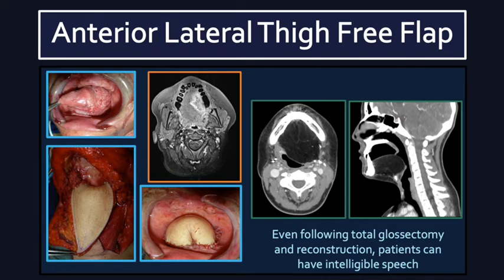Notice the mounding posteriorly, this monotonous fatty attenuation of the flap, and the smooth surface of the skin in the recreation of the floor of mouth. These patients have intelligible speech.